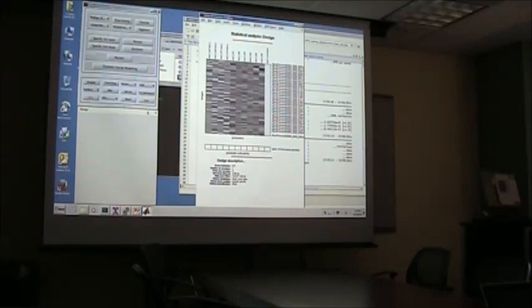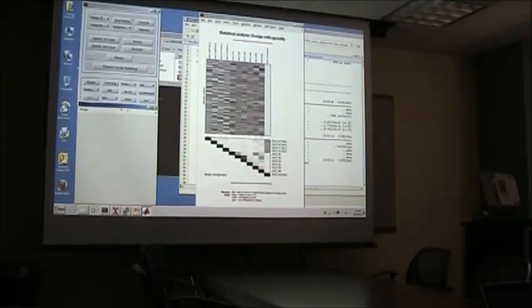After you run this model, you have this option here, design. I guess there are two things that are good to do. This one is to look at the design orthogonality. Basically, it means how correlated your regressors are. This is one thing to always check in your design. So how strongly is this regressor part of your model correlated with this other part of your model, which is something you usually don't want in any kind of model, not in fMRI, but also not in behavioral data.